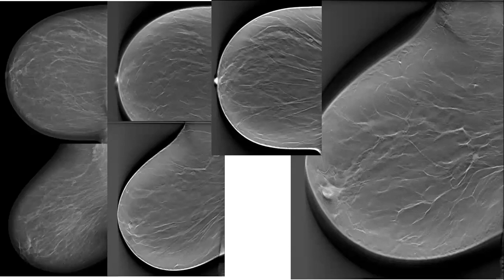From the system I brought for you, a patient with multiple small nodules reported as intramammary lymph nodes, and there is one faintly seen here on the MLO, okay?